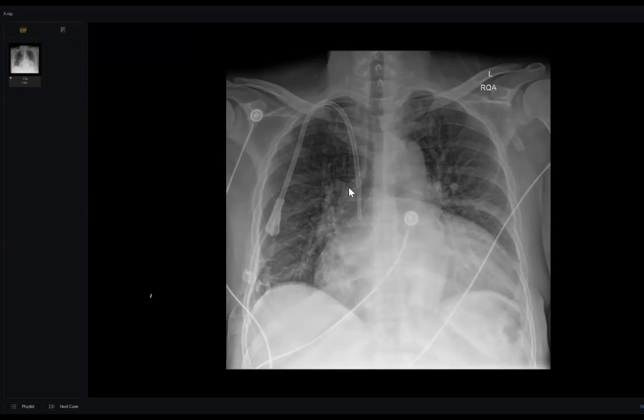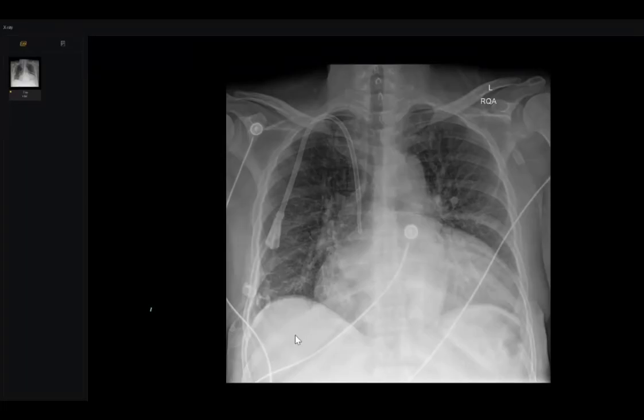Chest pain. Go on. Okay, this is an X-ray chest of a skeletally mature patient. The patient is in an ICU setting, as I can see that the multiple chest leads are seen in situ, and there is also a tunneled catheter noted in the right atriocaval junction in satisfactory position. However, coming to the cardiac size, it appears to be enlarged. There is also evidence of horizontal lines noted in the periphery of the right lower lobe that may represent pulmonary edema.